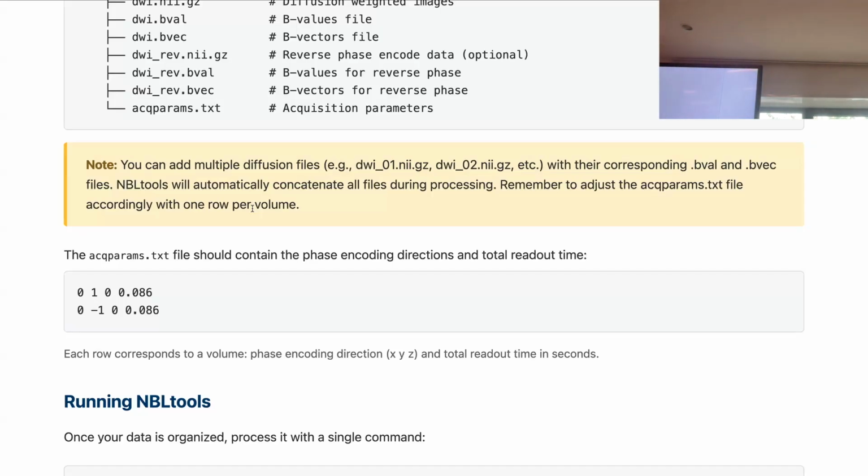I'll come back to that, because in the past we had another option called run all, run all topup. And run all was essentially doing everything except topup. But we now discourage that completely. You should do something for it anyway. And the solution is using SynB0.